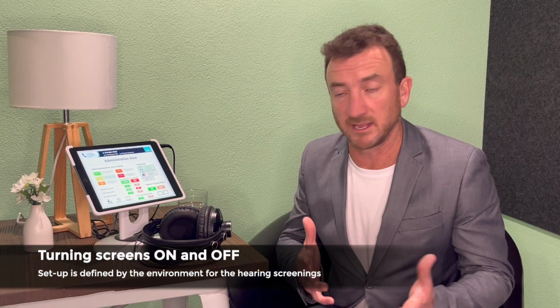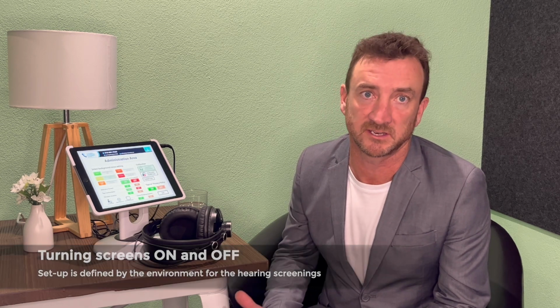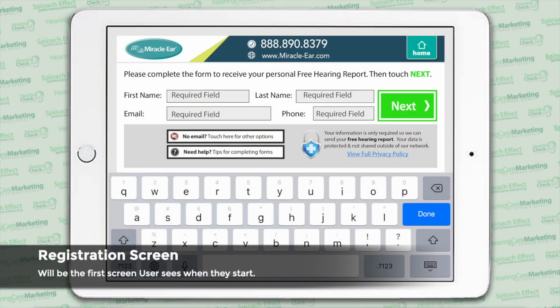Now we also have the ability to turn certain screens within the application off. And that really depends on what setting you are going to be doing your testing in. If it's in the clinic or in the hearing centre and you're doing pre-screenings, then what I would suggest is you turn the welcome screen off so that the first screen that the user will see is the registration screen, because your staff member can then help them enter their information into the application and then put their headphones on them in the correct way.